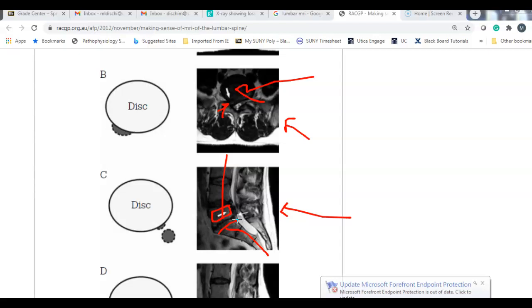In the fetal skeleton, the skeleton starts as cartilaginous structure. So in the sacrum, it's cartilage and there's 5 fusion centers to it. They fuse together into one hard bone, but you could actually look on a real sacrum and see there's 5 separate parts to it. So anyway, this would be S1. Some radiologists will say the L5 S1 juncture. That's why.